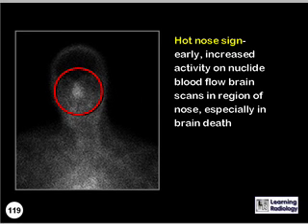What is the name of this sign? This is the hot nose sign, representing early and increased activity on a radionuclide blood flow brain scan in the region of the nose, especially in individuals with brain death.